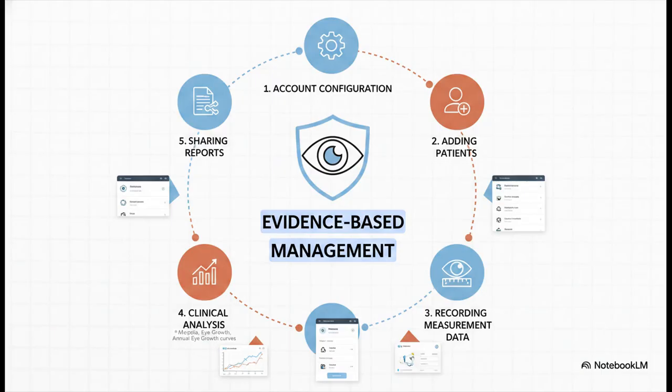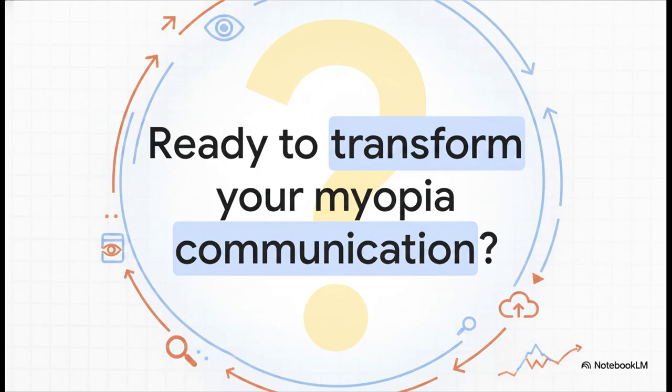To synthesize everything we've covered across this entire workflow, Myopia Care truly empowers your practice. From the initial back-end setup and efficient patient intake to the precise data entry and deeply powerful clinical graphing tools, all the way through to modern patient communication, it provides literally all the tools necessary for professional, evidence-based myopia management, all in one cohesive ecosystem. Which leaves us with just one final thought. Are you ready to seamlessly integrate this workflow and transform how you communicate myopia risks to parents today? The tools are right there at your fingertips, fully ready to elevate your practice and your patient care.